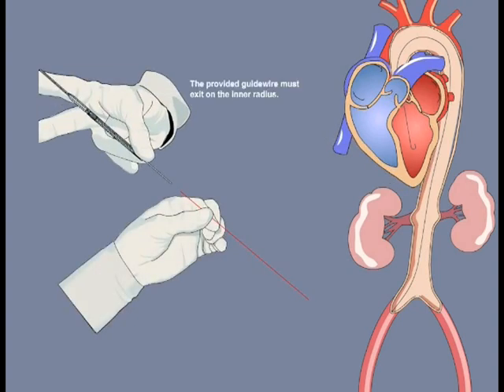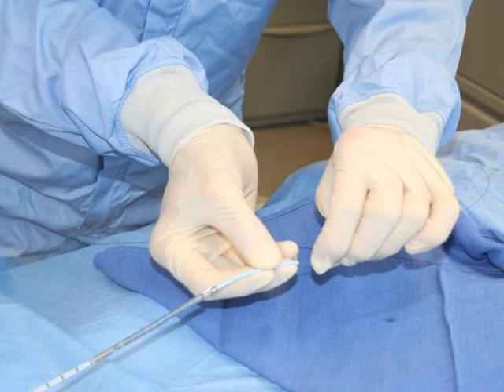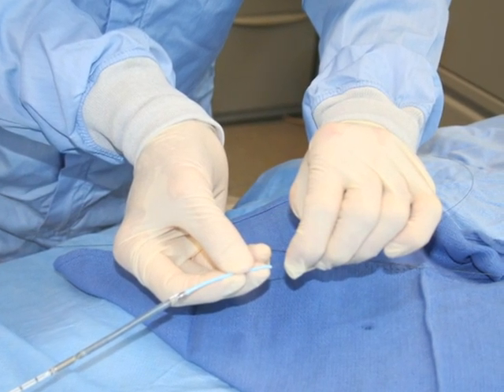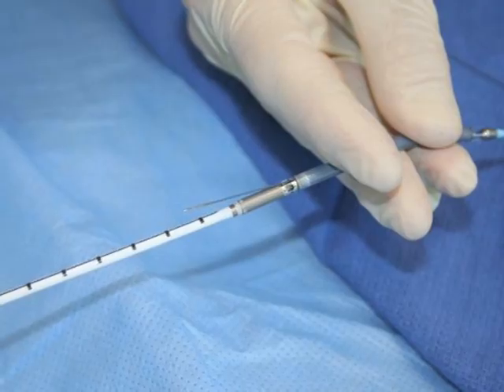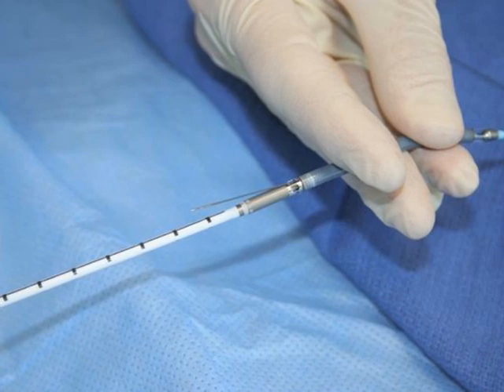To do this, wet the cannula with sterile water and backload the pigtail section of the catheter onto the placement guide wire. When backloading the wire, gently hold the pigtail and feed the wire through the pigtail's distal tip. Limit the handling of the distal tip to prevent damage to the inlet just proximal to the pigtail.